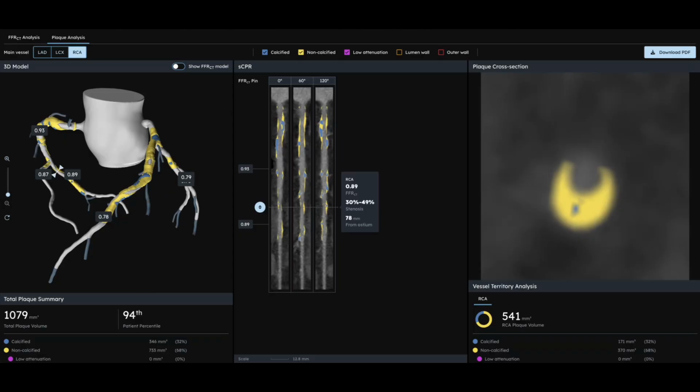So now the critical question is, is this impacting blood flow? Normally when you have greater than about 40% stenosis, that's when we really start to see an impact. But stenosis alone doesn't tell the whole story. You can have 60% narrowing and it not affect blood flow, or you can have 50% narrowing in another patient and it significantly restricts it enough for you to need a stent or a bypass. And that's why we use FFR.